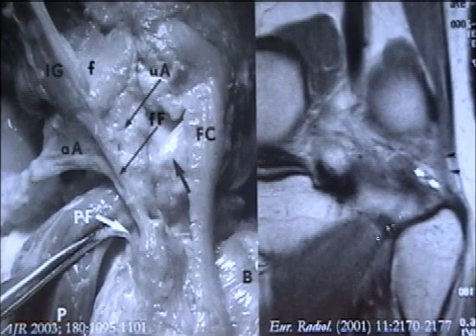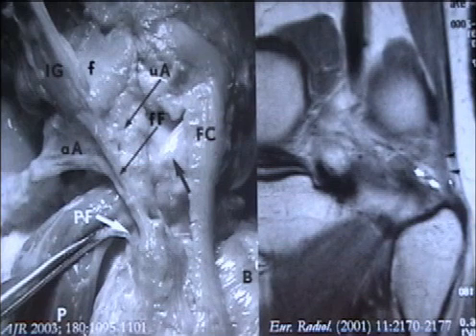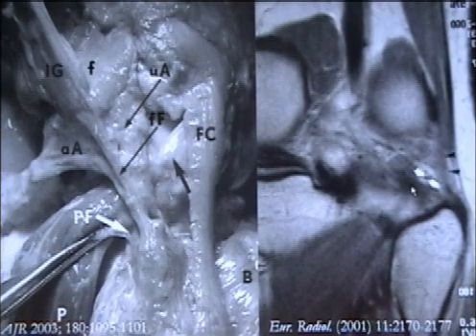If you look very closely here, this is unfortunately not my image. I wish I had some nice images to show you. But these are the two limbs of the arcuate ligament. One is here. This is the other limb here that's being outlined. Those are the limbs of the arcuate ligament. So very hard to see, although occasionally you can see it.